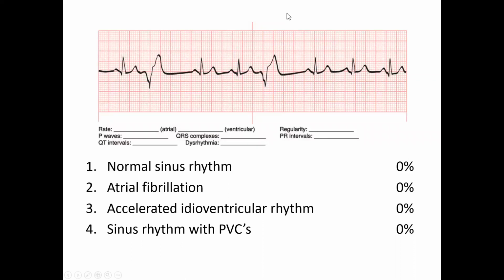So now let's take a peek at this one. If we go in here, we've got our ventricular rate, so we'll look at our ventricular rate: 1, 2, 3, 4, 5, 6. These are potentially, so maybe 8. Our atrial rate: 1, 2, 3, 4, 5, 6. Our rhythm, because of these things here, we have an irregularity to it.